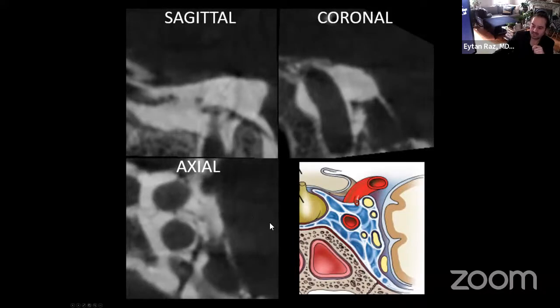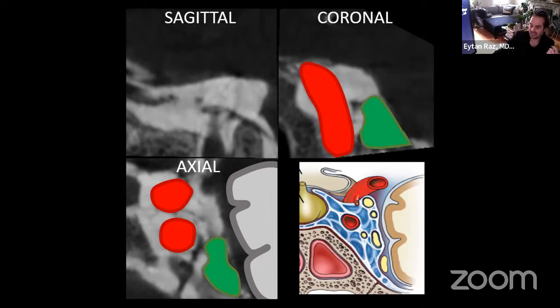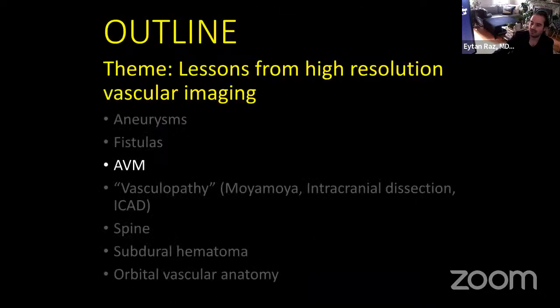We see this is the carotid, okay, the brain there. We see the carotid there, right? Again, sagittal, coronal, axial, and then we start seeing what else? This is the trigeminal ganglion, right? And what is this? This is the 6th nerve crossing through it, right? And what is this? This is the oculomotor nerve, right, more anterior. So this is just a way imaging can certainly have useful use for clinical roles, but also academically to understand things in a better way.